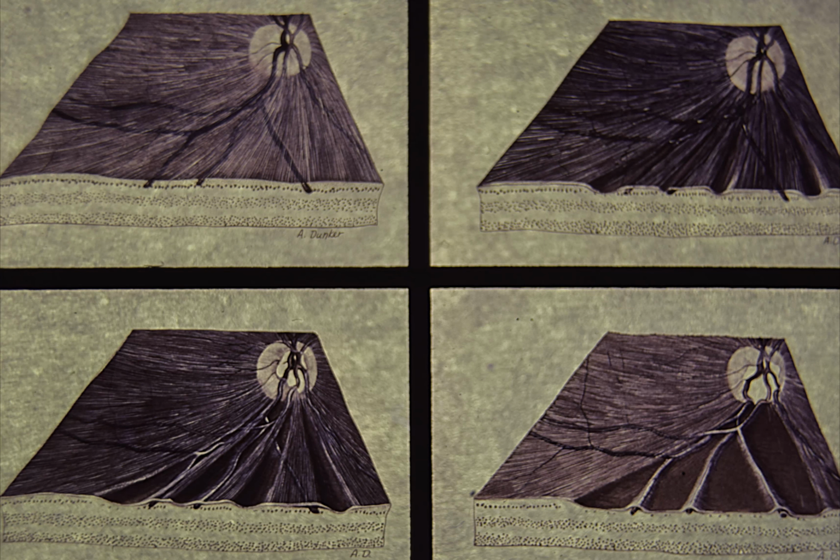Lower left. When nerve fiber layer destruction continues, the optic disc becomes pale. The artist's sketch shows areas in which the normal striated pattern of the nerve fiber layer is markedly reduced. These areas have a dark appearance in red-free light. In cases of sector pallor of the optic disc, a corresponding area of nerve fiber layer dropout is visible. Lower right. In diffuse, severe axonal destruction, not only is the optic disc pale, but there is extensive loss of normal peripapillary retinal striations. The retinal vessels are seen more clearly due to the absence of overlying retinal nerve fibers.